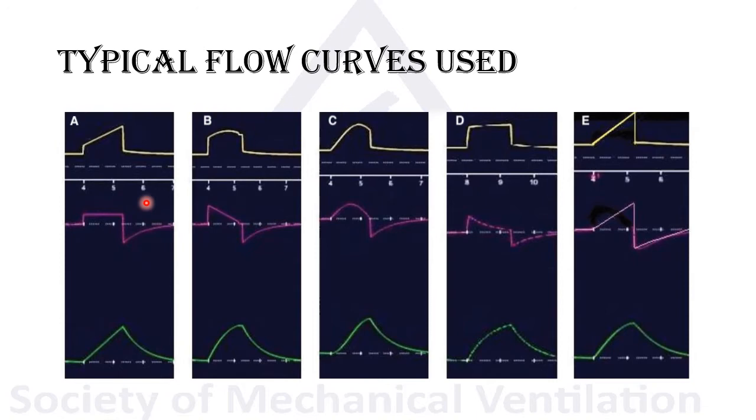The descending flow, again, goes very fast in the beginning to the point of maximum inspiratory flow, and during the breath it decelerates, goes down, and gives almost a semi-square airway pressure. This also can be used in volume control modes too, and pressure support.